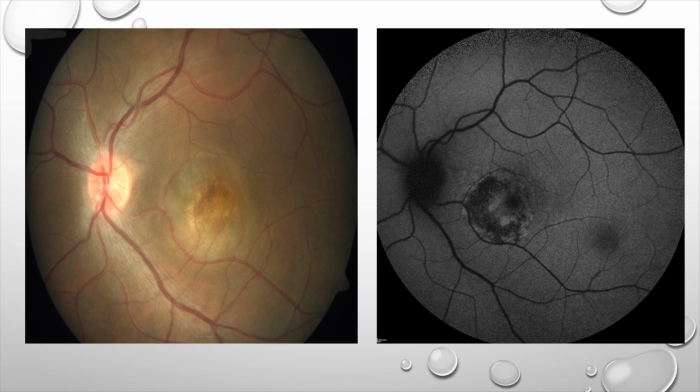Yes, ma'am. It is not in the same plane. So that should give you a clue in a two-dimensional picture that we are probably not appreciating everything in the same plane. And the focus also will be different. If you see, the vessels will be more clear, the one which is raised in front. Correct. The one which is down will not be as clear. So that is another clue that one is shifted in front and another one is staying behind. So that should be the clue on a two-dimensional picture if you are not having a depth perception.